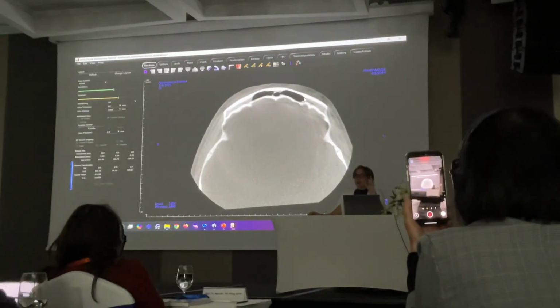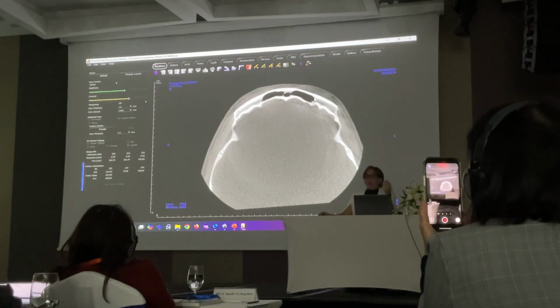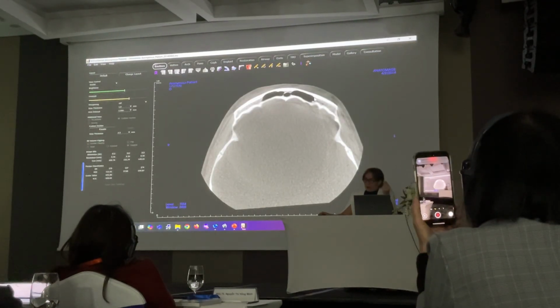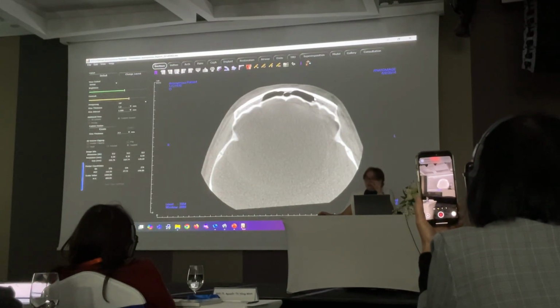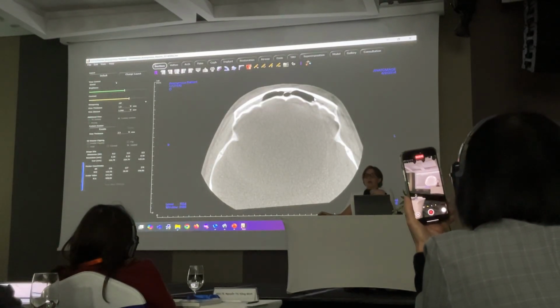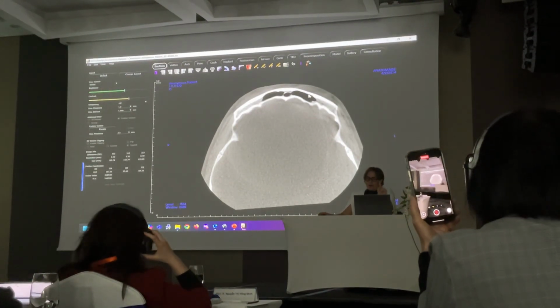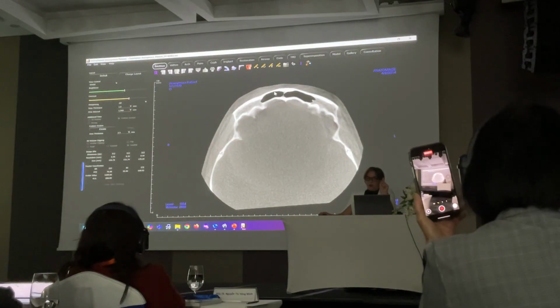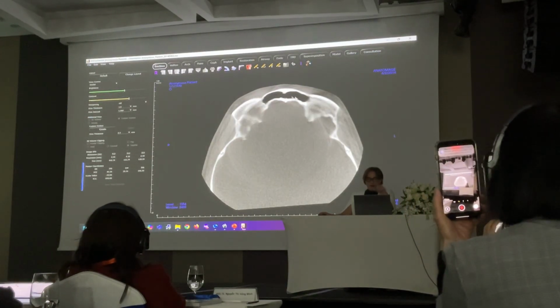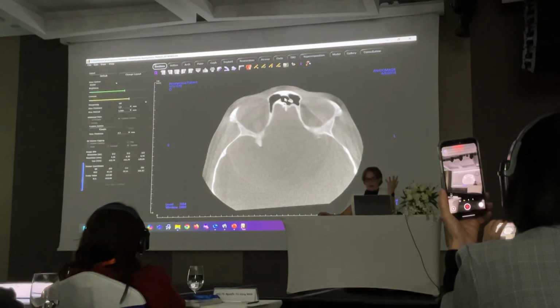There is a very thin layer of soft tissue called the Schneiderian membrane, which is the respiratory epithelium, which is usually not apparent on cone-beam CT because it's smaller than the voxel size. It only becomes apparent when it becomes inflamed, okay? So that's something you're looking for. You want black on white, okay? As you go through, black on white. You're comparing both sides to one another, black on white, no gray, okay?